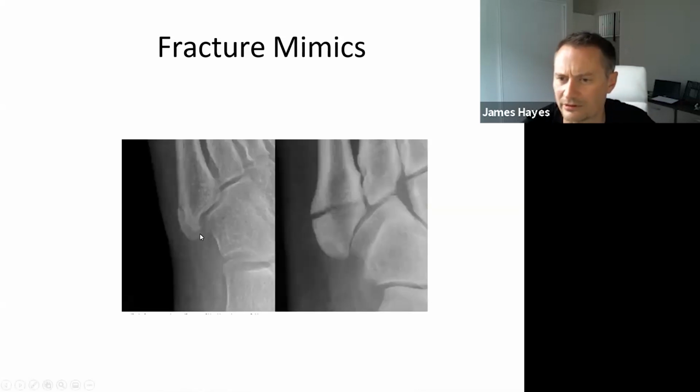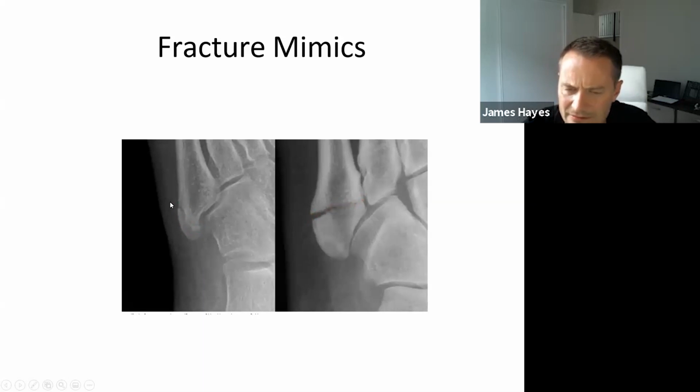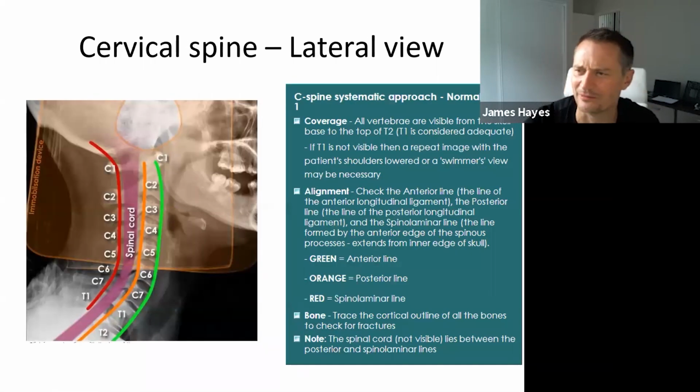Okay, so here's another one, the corner of the foot. You've got an avulsion fracture here. Can you see the difference? Oh, sorry, I forgot you guys can't reply to me. I find this system a little bit weird.